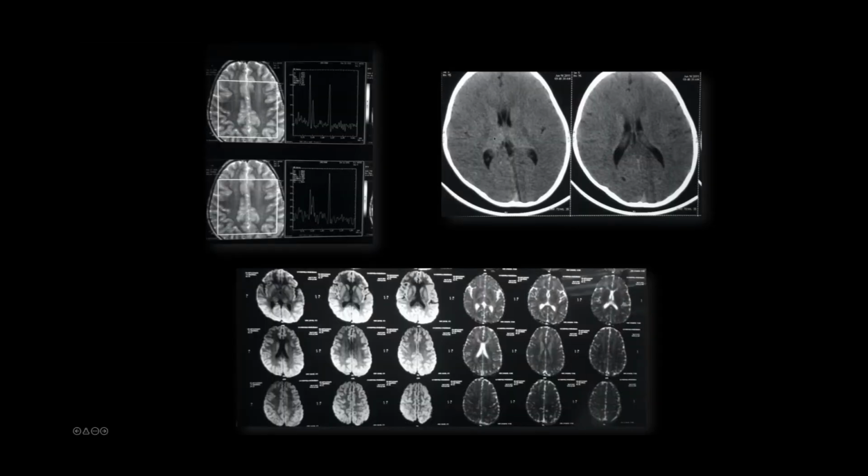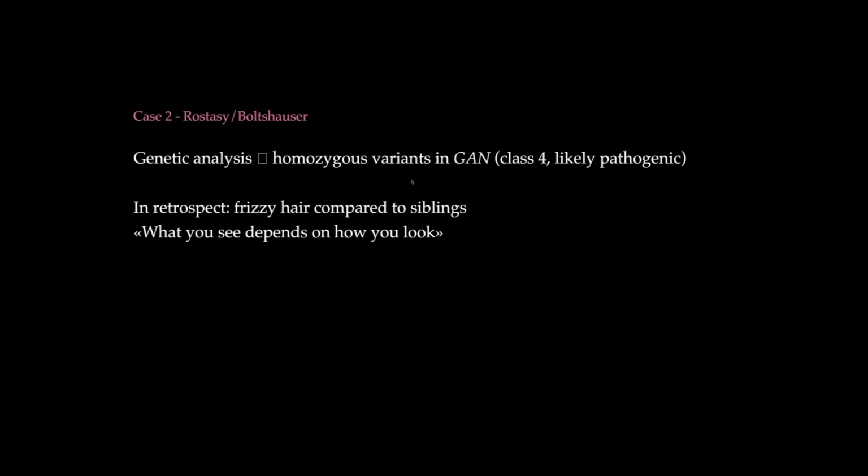On CT brain, the thalami appear slightly bright, or some hyperdensities are seen. No abnormalities on diffusion or ADC. Spectroscopy also, I could not appreciate any significant changes. So going back to Dr. Boltshauser's case, Aigen, do you want to confirm the diagnosis?